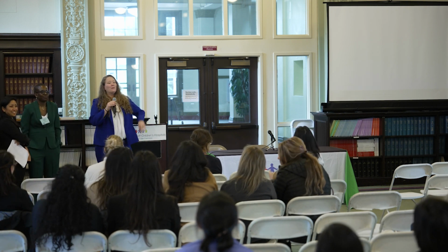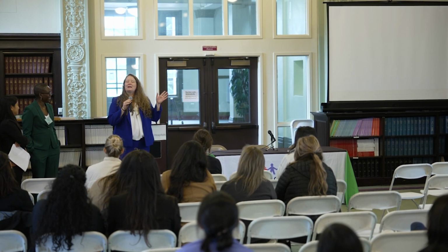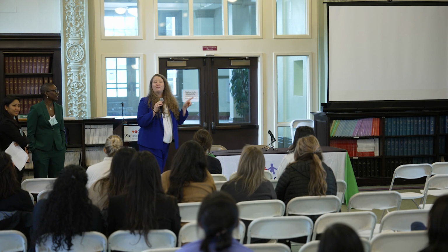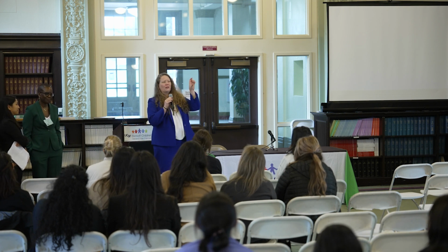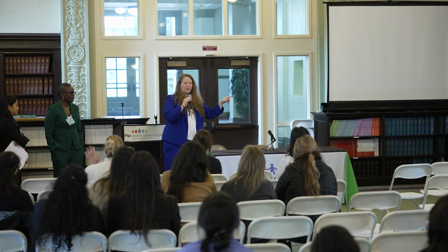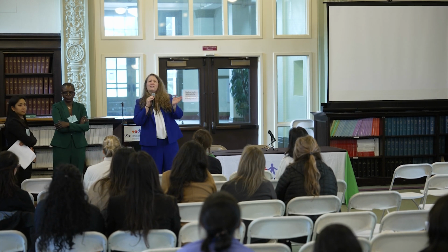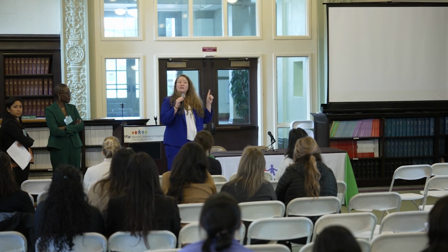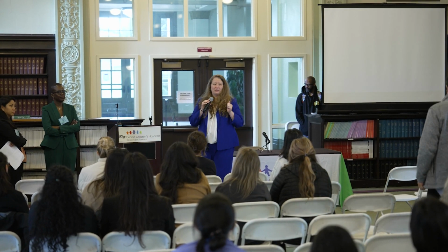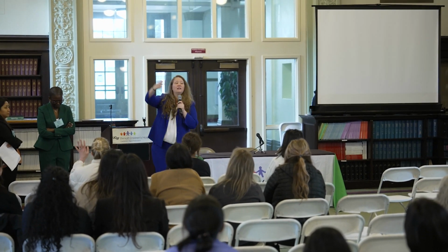Any other riveting things? I might just have to point out for the people who said skiffy for that one thing instead of Perthes, let me have this be a teaching moment: we don't really see slipped capital femoral epiphysis in children under 8. So I think that was a 4-year-old. Yeah, a 4-year-old with an abnormal looking femoral head. But anyway, a 4-year-old is going to be Perthes until proven otherwise. A skiffy doesn't usually happen until you have somebody over the age of 8, and really usually over the age of 10. Although when you have young females, for example, those who are starting their menses at age 9, they absolutely can have a skiffy when they're younger because that's the sort of skeletal maturity that they're at. So anyway, Perthes in the young, skiffy in the older.